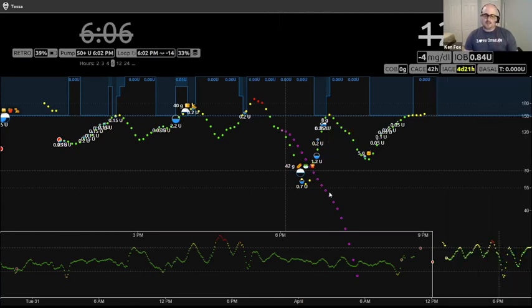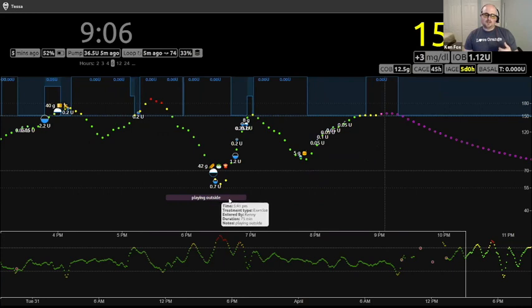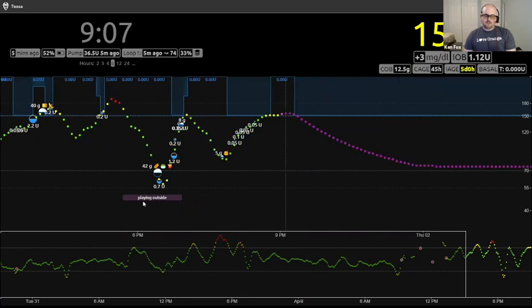And then you'll see this activity load eventually. Underneath that time, there it is. There's a bar down here that says playing outside. I can hover over it, and if I had put any notes, which I did, I could see it as well. And you can kind of see that I think it did a little too long. Oops, sorry. Math on the fly, not working so well. So excuse me. You can see kind of where the activity was, or the exercise was.